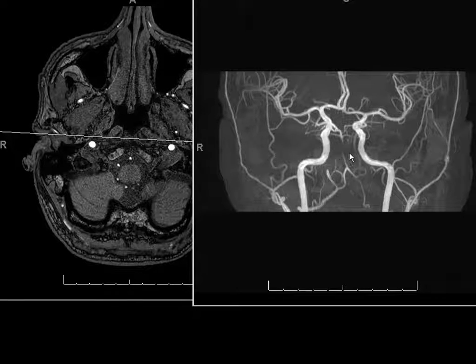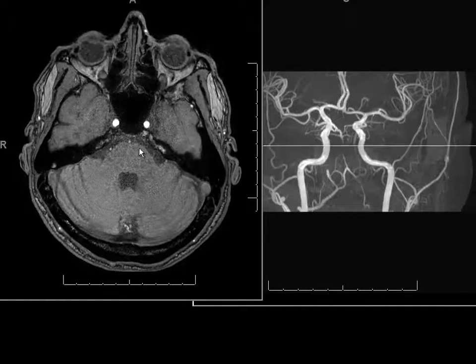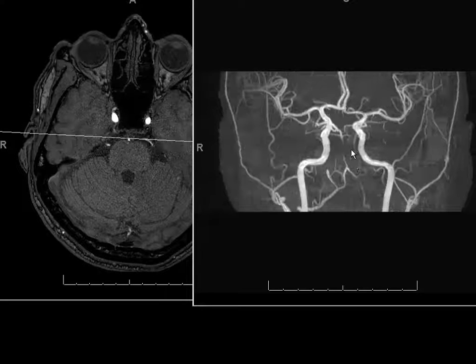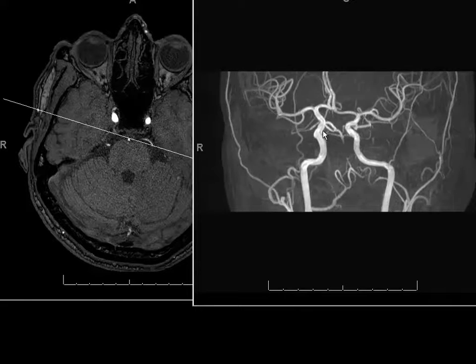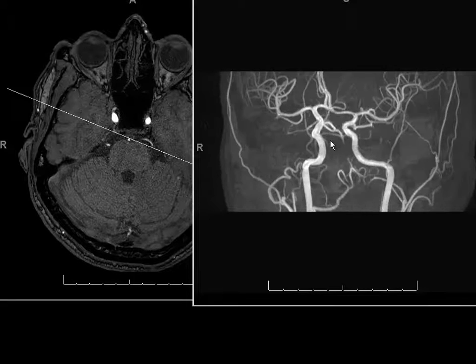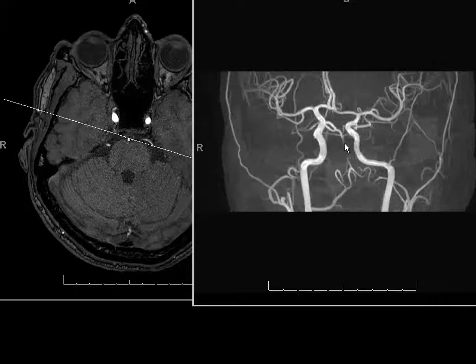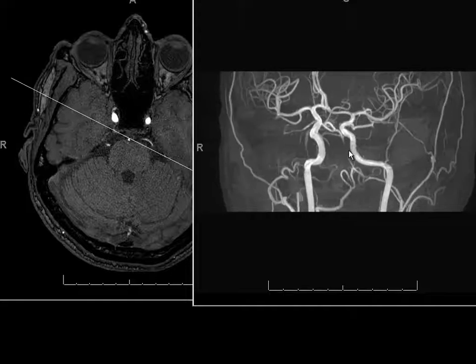By the way, the basilar artery also demonstrates a focal area of lack of blood flow. Maybe the pressure from the right vertebral artery is not powerful enough to overcome this area to supply the tip of the basilar artery. The patient has fetal origin and patent bilateral posterior communicating arteries, so maybe they are supplying the posterior circulation above the mid-basilar artery.